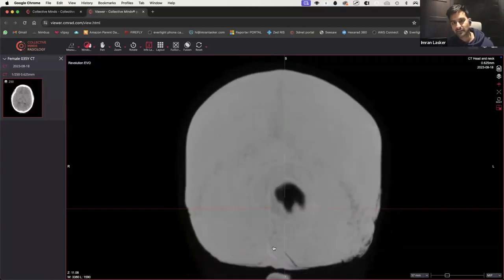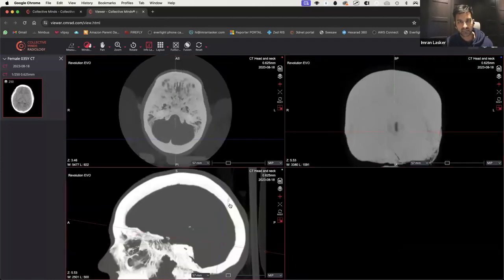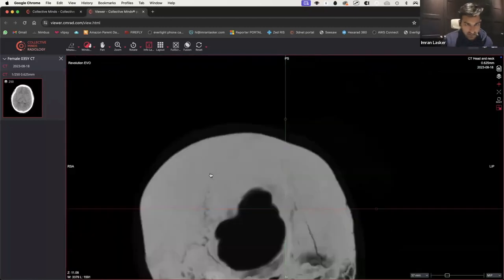And can you see that? That doesn't look quite right. So then you've got to manipulate it a bit. So I will show you. So this is suture. I'm going to zoom in a bit. So this is suture, this line here. Nice wavy line because you've grown up with that, right? You've grown up with that. It's been part of you forever.